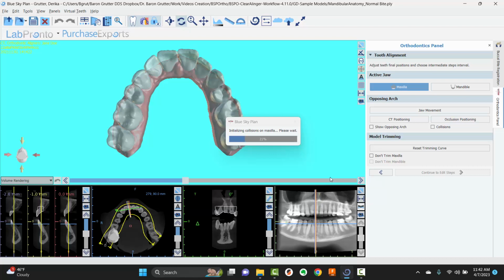And I kind of like to let it just do its thing, let you guys see the real time. The only thing I didn't do is that first part that it was doing, and that's just because it was sitting there. It takes about probably 2 minutes of just sitting there, and it was a great excuse for me to check my messages and drink a little bit of coffee.